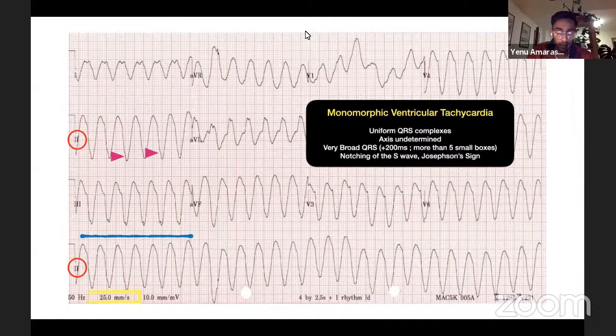And I'll go on to the last ECG. I will leave it up again for a minute or so, and you guys can send your answers into the chat.